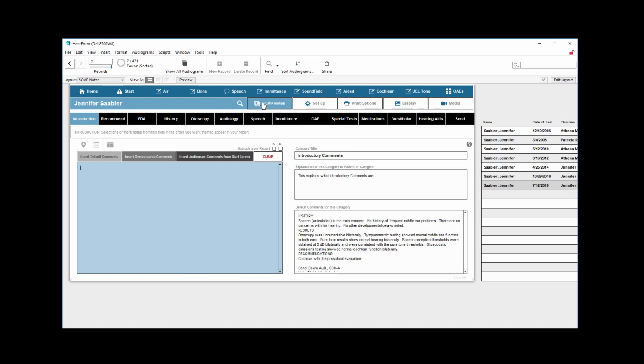This video is a 30,000 foot view type of video that will cover very quickly a number of different features within the Soap Notes area. The video is not designed to give you great detail. Please see subsequent videos for that purpose. But I want to go very fast just to give you an overview.